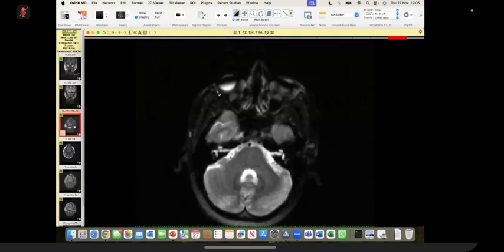So now this is your case of a 41-year-old male. You can ask for the mouse. Yes. Okay, yes, sir. So I have requested. I am provided with, the patient has got swelling in the neck bilaterally.